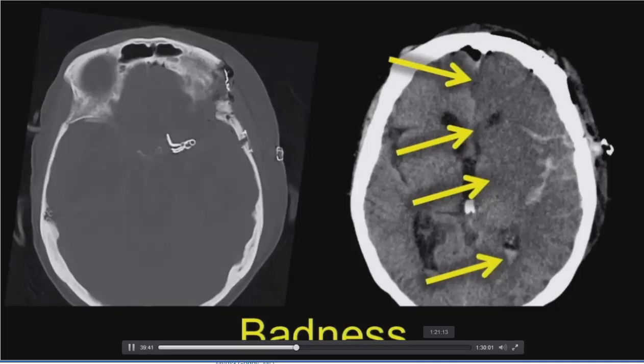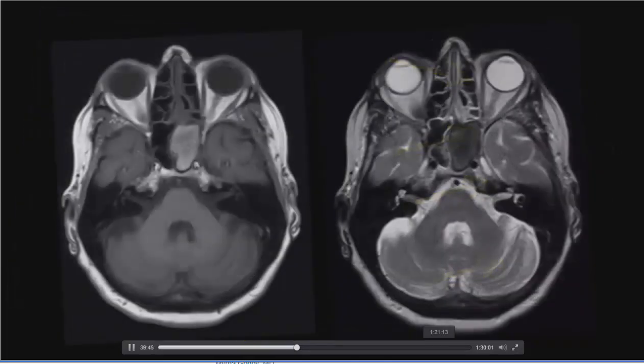But this is a case where somebody showed me later and said, oh, we had this horrible case. We showed it at QA. And as soon as they pulled it up and showed it to me, I said, well, what's going on in the sphenoid sinus? This is one of those cases where you have the stack, and the first image that comes up is number 1 around the skull base. So the very first image came up, and I said, well, what's going on in the sphenoid? And they all went, oh, well.